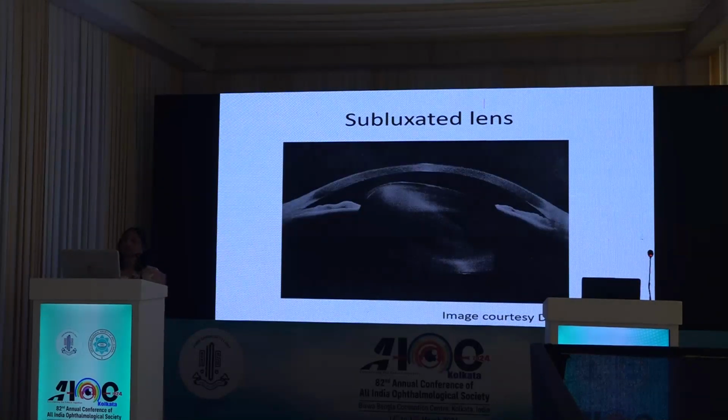Now, all these pictures that I had shown earlier were taken on the retinal systems, converted from the retinal scanners. Now, this one is a dedicated anterior segment OCT system, Anterion. You can visualize almost the whole of the anterior segment. It's very nicely shown, a subluxated cataract with a tilt and irregular anterior chamber depth.